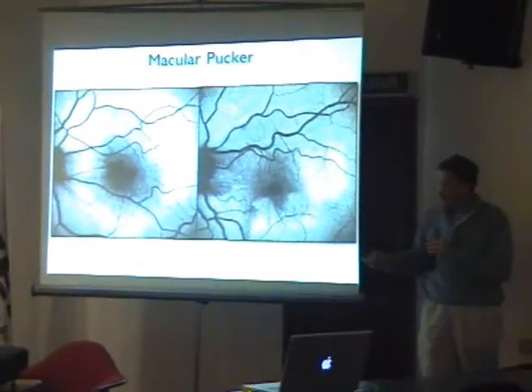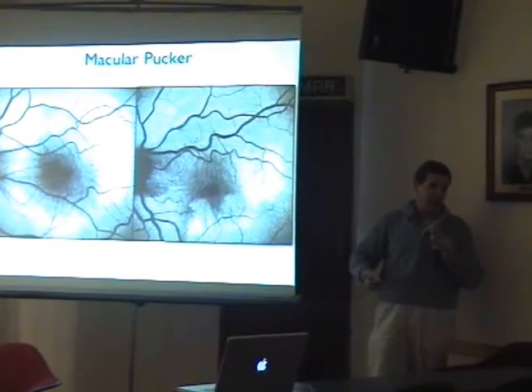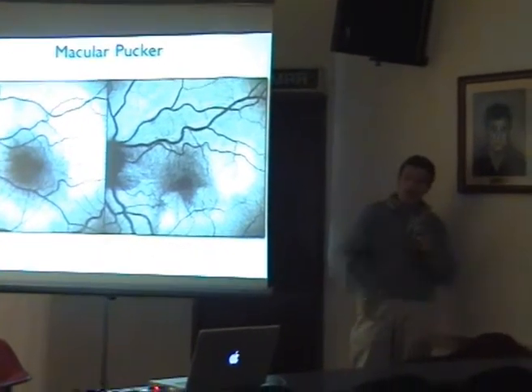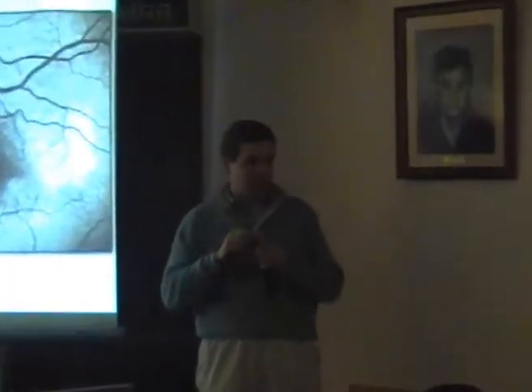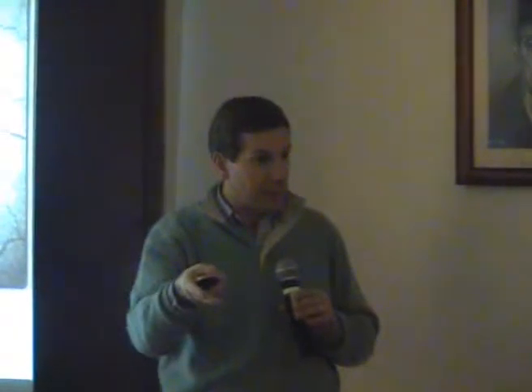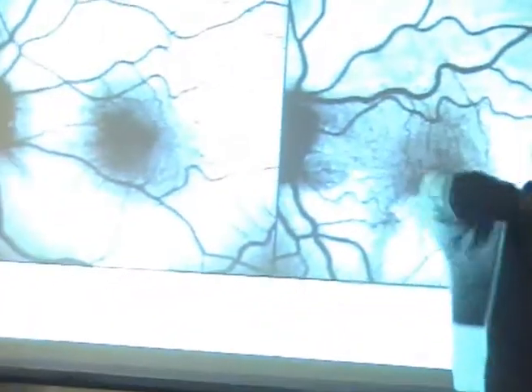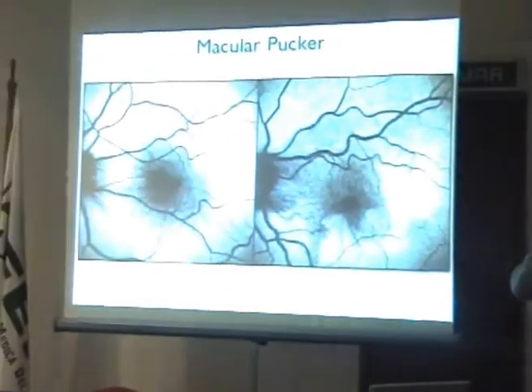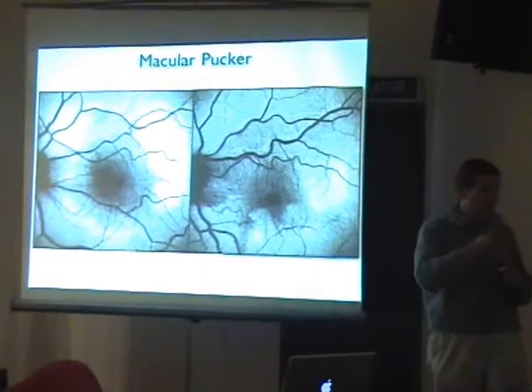The problem is that it's not easy to find this type of patients, and since we have the Spectralis, we have no patient with this shadowing. The other test that we are trying to do is the dark adapted and light adapted, because if it is just due to the photopigment around, it will disappear if I bleach all the photopigment.